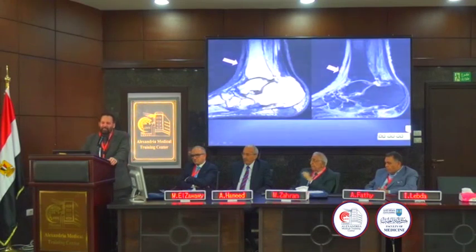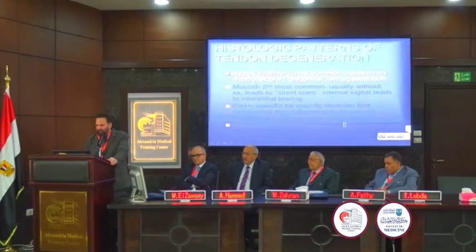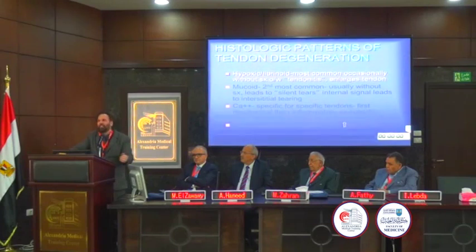So here's the anterior tibial tendon, post-contrast image, synovitis around. So there are 4 types of histologic abnormalities in degenerated tendons. And you should be able to describe each of them on images because they have characteristic appearances and they have characteristic prognoses. The most common is termed hypoxic. And we said, Mohammed pointed out, it's hypovascular, so it's prone to hypoxic degeneration.